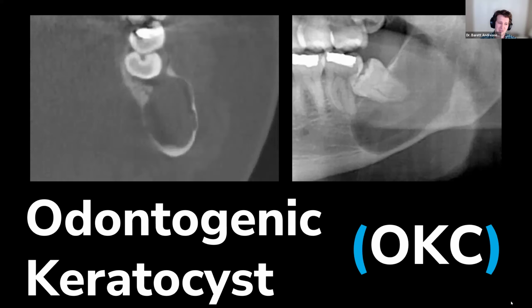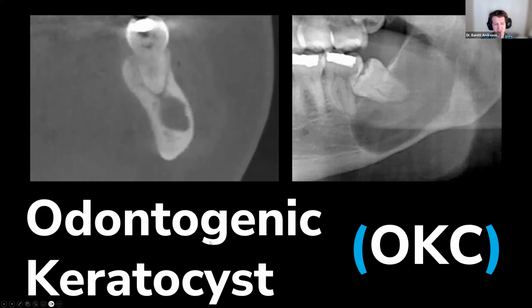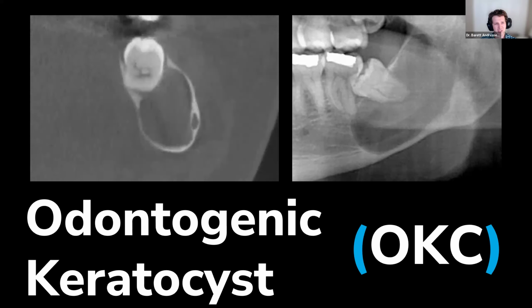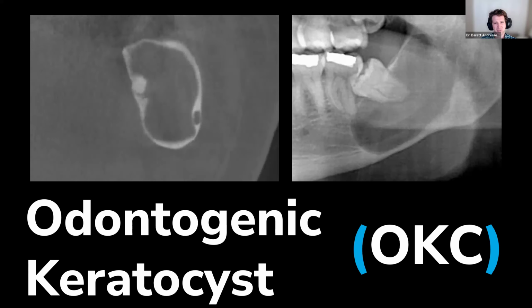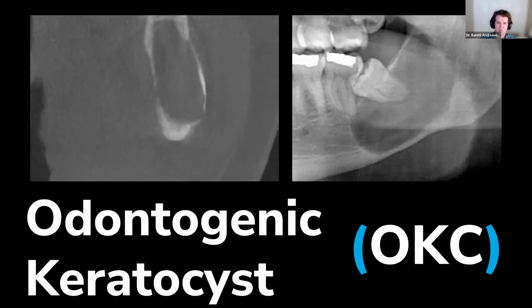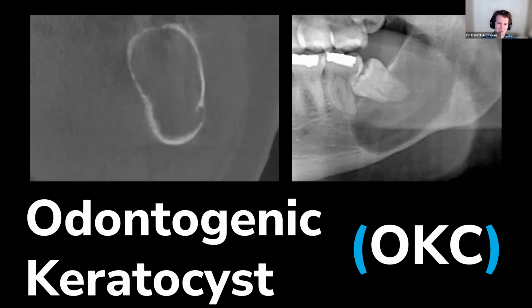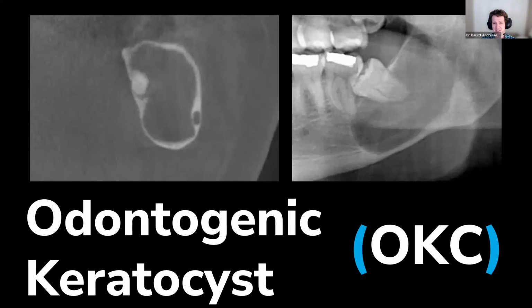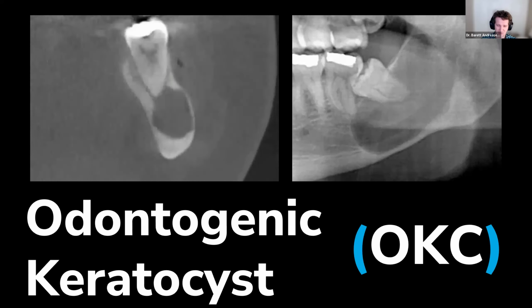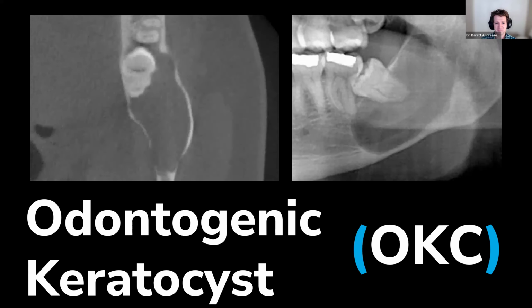In cases of odontogenic keratocyst, typically these lesions don't cause as much expansion as some of our other lesions. So you'll typically see them with an elongated appearance where maybe you'll see them throughout a quarter or half of the mandible before you really get much expansion of the mandible itself. Not really something that you need to know, but just a fun fact about odontogenic keratocysts.